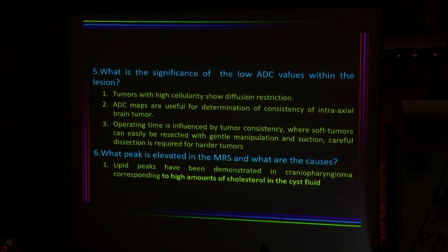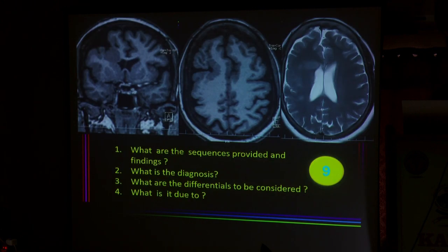The peak that is elevated is the lipid peak, which can be seen in craniopharyngiomas, which reflects the high amounts of cholesterol.